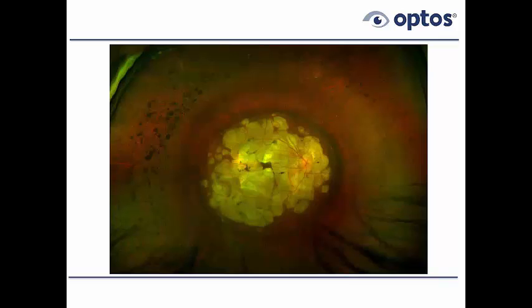Sometimes it's relatively rapid. In dry macular degeneration and something called geographic atrophy of the retinal pigment epithelium, you can see changes over a period of just a couple of months, where you have a big black center, and then you have a peripheral band around it, which is bright hyperautofluorescence. If you look at those patients every 3 months, and I've done this in several cases, you can actually see that the bright zone is then replaced by a dark zone, and the bright zone just continues to go further out, meaning that the lesion itself is getting bigger.